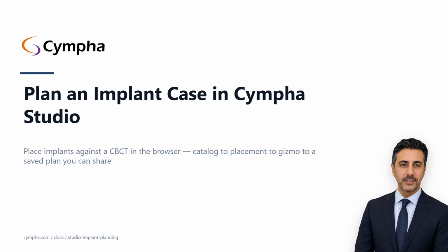By the end, you'll know how to open the implant toolbox, pick an implant from the catalog, place it on a tooth using the three-dimensional view or a slice, fine-tune the position with the gizmo, save the plan to a file locally or to your cloud, and notify a colleague.